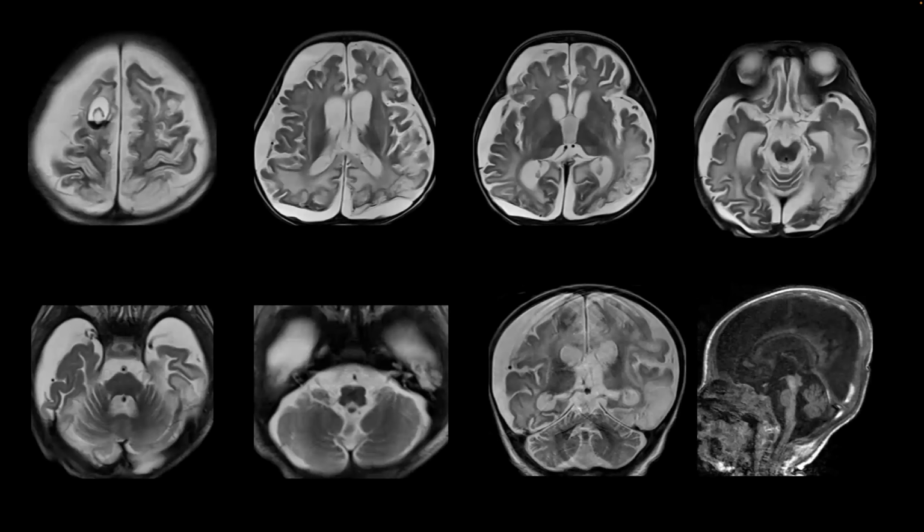Follow-up MRI 20 days later, child, and this is the scan. Significant progression in comparison to the first MRI: significant atrophy, gliosis, Wallerian degeneration in the cerebral hemispheres on both sides, ex vacuo dilatation of the lateral ventricles, subdural collections on both sides. There are also some parenchymal hematomas in the right frontal lobe with fluid layers.